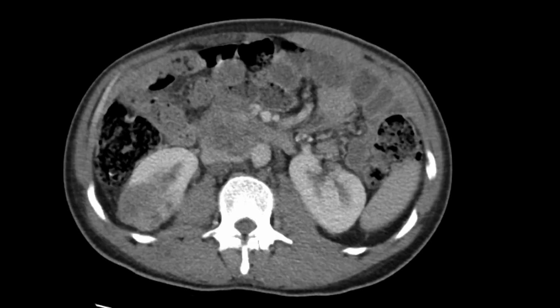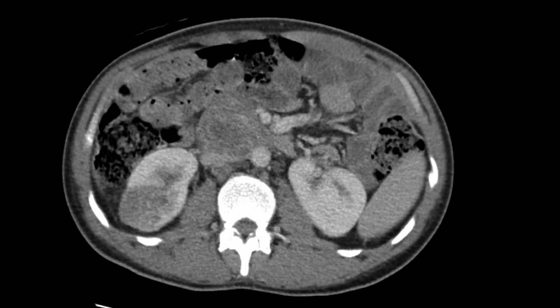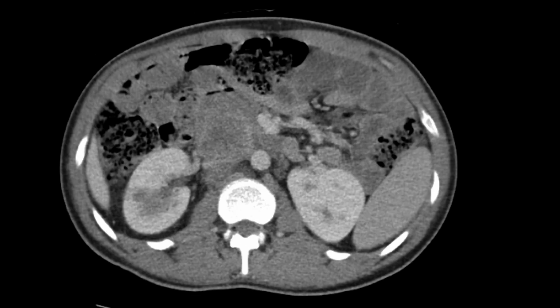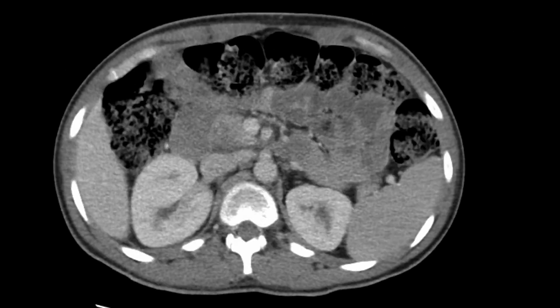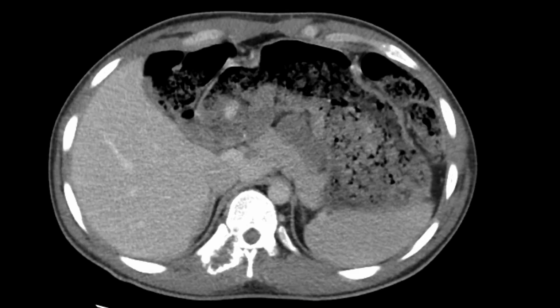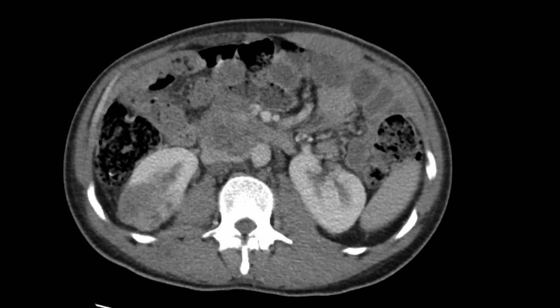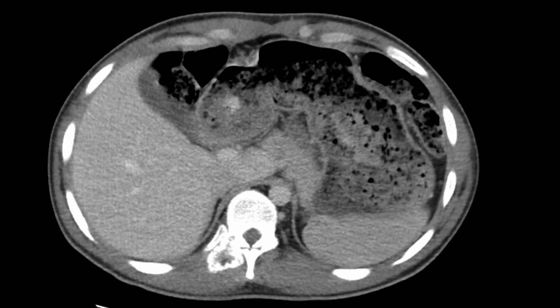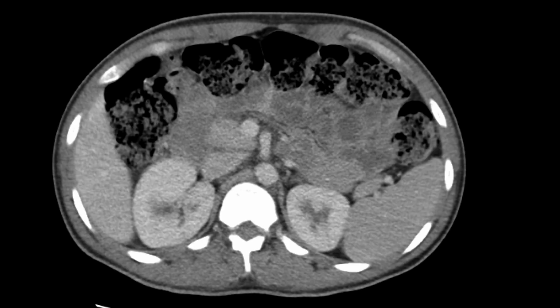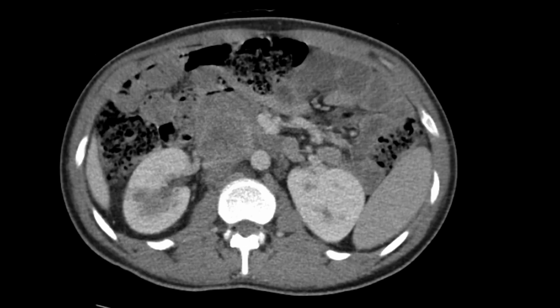And so a young patient in their 20s with this infiltrative, expansile, heterogeneous appearing renal mass with really extensive disease on presentation, including retroperitoneal adenopathy and osseous disease. Certainly, common things being common, we're going to think about clear cell RCC, renal cell carcinoma. But another disease you want to think about when you have certainly a young patient with quite extensive disease, despite the fact that this is not a particularly big mass, is medullary RCC.